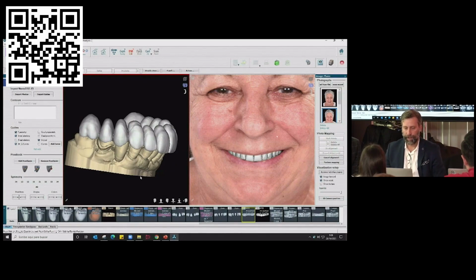So what we do usually on cases like this, and many clients ask for that also, is: I understand we need to go for the lower, but it's not going to be now. So for the surgery, the immediate loading, I need you to try to adjust as best as possible the upper design to her actual lower. Okay, so we did that also. I made some small modifications on the lower, especially on the occlusal, to make us have less work on the lower at this moment.